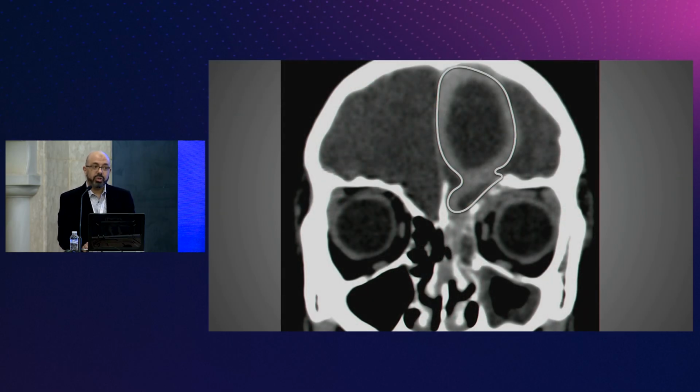This is a huge intracranial abscess. Is it subdural or epidural? So this is limited by the falx, so it's following the falx. So it can't cross the midline, which means that this is a subdural abscess.